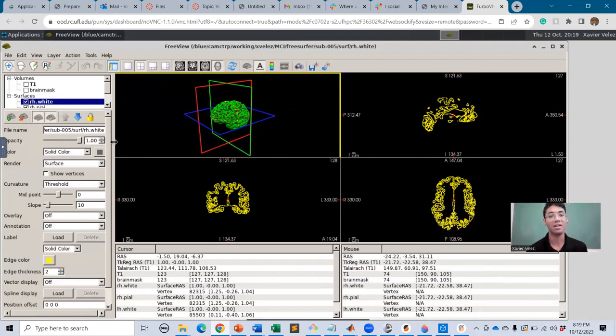So I will say, if you were ever using some sort of slicing tool for CT scans, or this one uses fMRI scans, it's pretty similar. I'd say the skills are pretty transferable. And so, yeah, it's a good skill to have. And I would definitely recommend practicing on different body parts as well. It can be a lot of fun just to see what you can pick out and just try. Yeah, what's up?